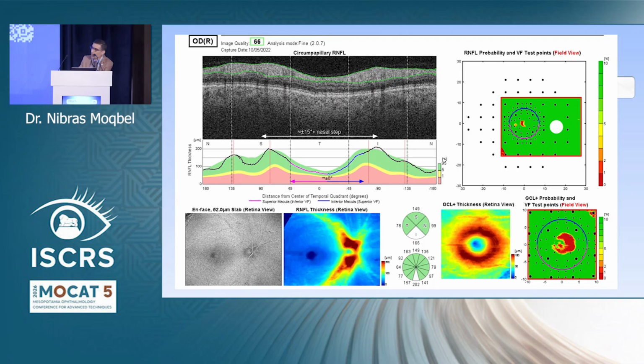Let's take another example for the nerve fiber layer shift. These are the sites of the vessels. And if you look at the retinal fiber layer plot, there are the red lines. The red lines are the lines for the vessels for the normative values. You can see there is a shift in the location of the vessels. This is the peak for this patient. It's a little bit shifted to the left compared to this. So it leads to focal apparent narrowing.